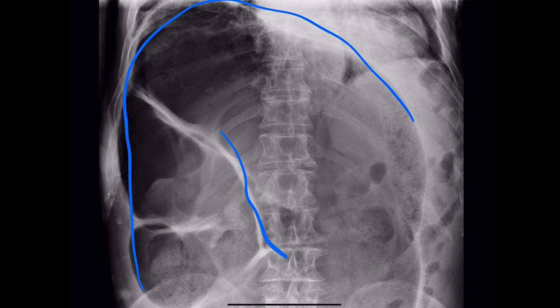It's something that we do look out for. I did try and mention that we see this in elderly patients a lot, but we get this sort of hilum up the middle of the structure, and this is very typical of sigmoid volvulus. In the pelvis, it's twisted around.